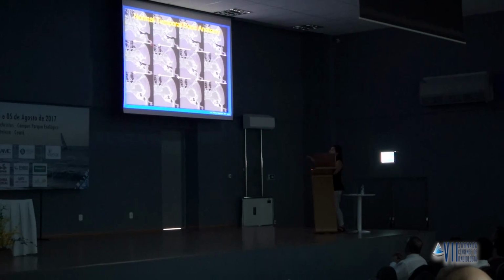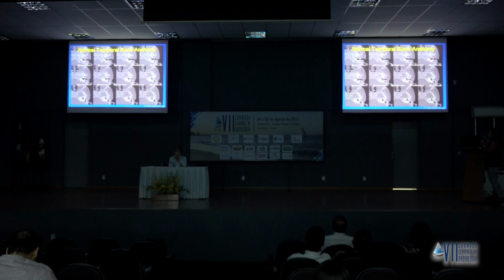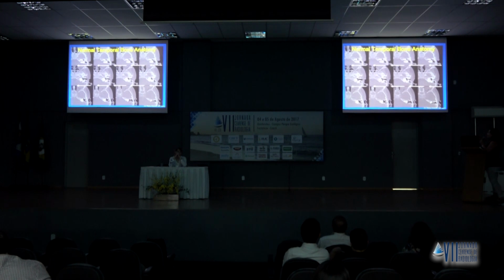And here you do see the pinna, the external auditory canal, nice and patent with normal morphology. Coming inward, you see the tympanic membrane, and you start seeing the ossicles. Moving more inferiorly, you start seeing the normal orientation of the malleus and incus. And moving further down, here you do see the typical cone, the malleus and incus lined up like the ice cream cone.